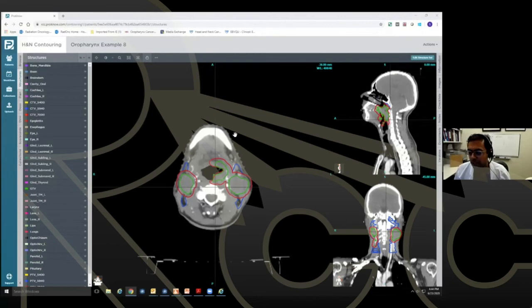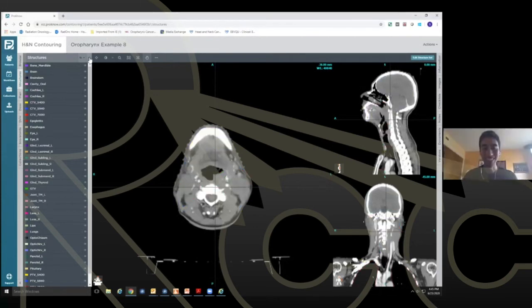Now with intensity modulated radiation therapy, we're not worried about clearing the shoulders as much, but yes, it could potentially change the borders, and that's where you have to use clinical judgment. Also, I've seen plenty of people with no neck, right? Pretty much the head goes to their shoulders. But my teaching has always been, if you're ever uncertain, it's okay to include a little bit more than less.